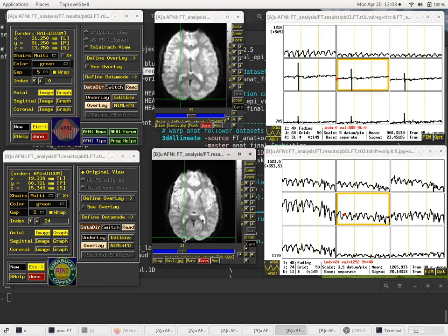So when you're going between orig space coordinates and the final space coordinates, they won't be an exact match. You notice on the bottom we're a little bit interior of the brain, and on the top we're at the very edge. So it's not exactly the same space in the anatomy, because the coordinate interpolation might be correct, but then you've got to include the fact that now the EPI is aligned with the anatomy and the anatomy is aligned with the template, so it's squeezed and stretched in different directions, and you're not at the same location in the brain.